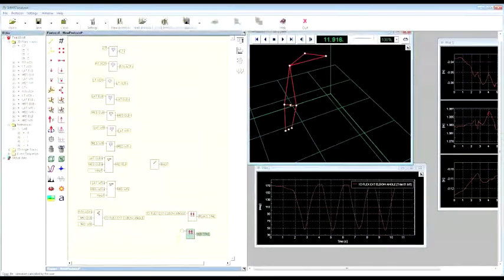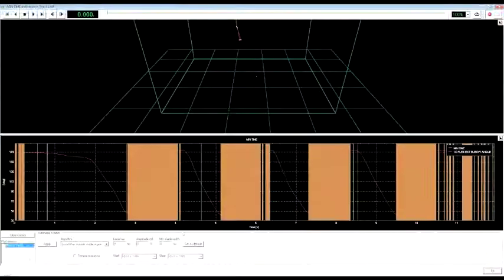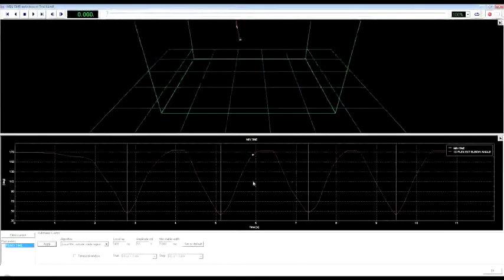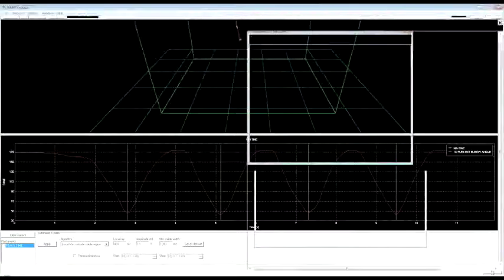Mean. And again, the input is the 1D angle. Now I'm going to look at the local minimum over the trajectory, and as you can see here, the algorithm is able to do that automatically.